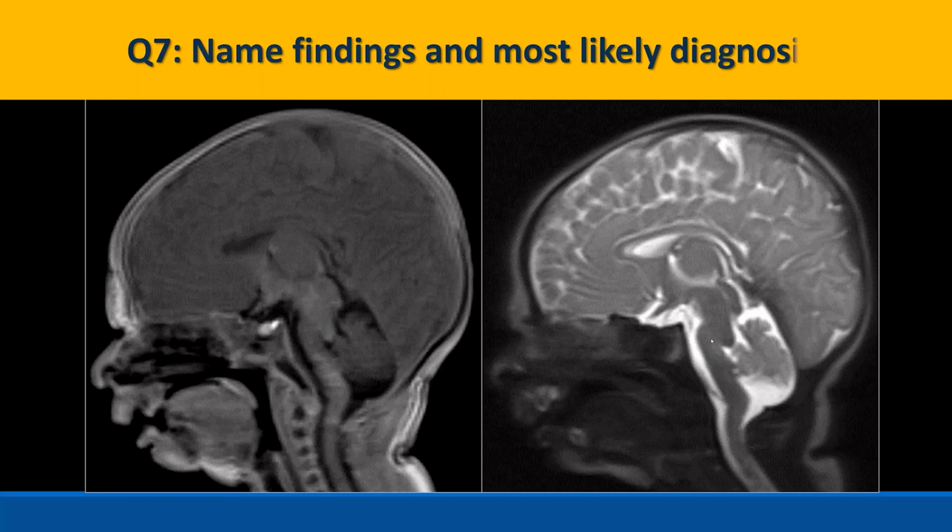The obex is kind of hard to see, but the fastigium doesn't look like it's in a normal place. I don't really see the primary fissure. It's hard to see really any of the fissures. Agreed.